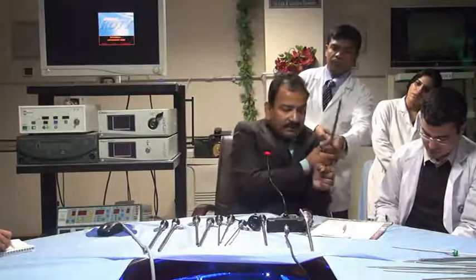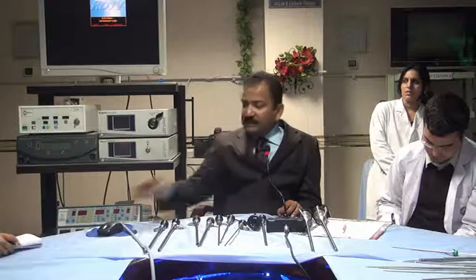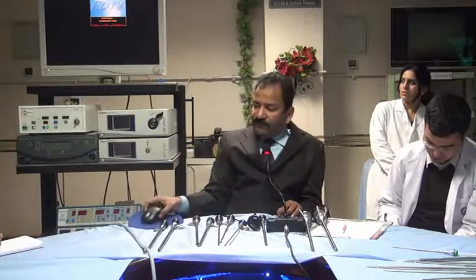So this was regarding the 0 degree. Now I will tell you, this was the first property, that is diameter. The second property is optical axis. What is optical axis? Optical axis is the angle between the longitudinal axis and the center of the field of vision.